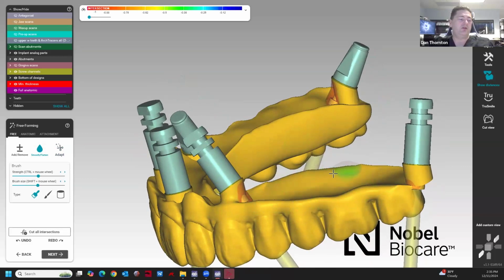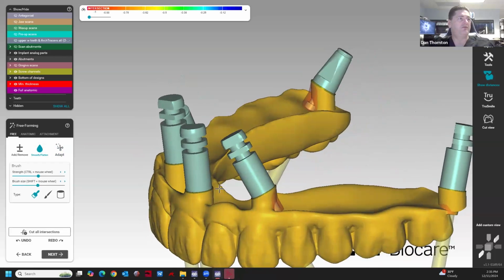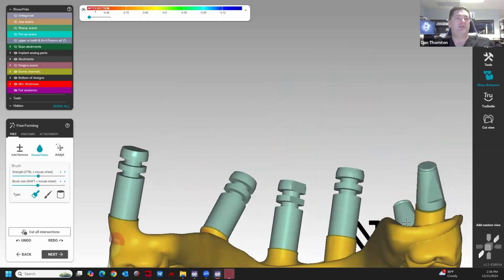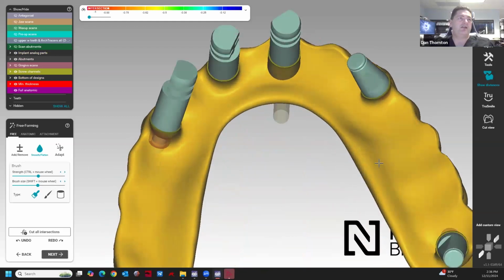And if you don't know exocad, what I'm doing is I'm smoothing it out, but I'm pushing shift. That makes it a little bit flatter compared to regular smooth. If you have the add and remove, you use your shift for remove. If you're using 3Shape, you can just toggle through your numbers for your add and remove tool. Right now, I don't care if it actually shows up red, I don't have anything there. You want to backfill, make it a little bit better.